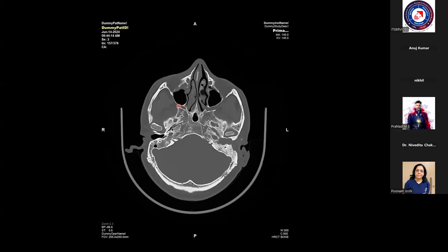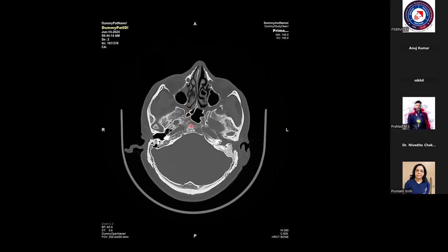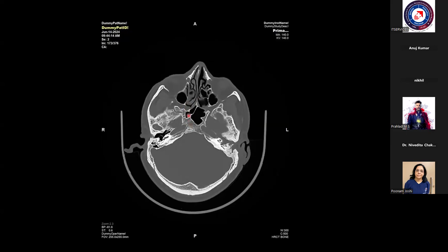This is the pterygopalatine fossa. Now I'm going above. I can see one posterior linear communication. This is the Vidian canal. Posteromedially, we have the palatovaginal canal, through which the pterygopalatine fossa communicates with the nasopharynx. Then again, if I go medially to the nasal cavity, it communicates via the sphenopalatine foramen. Now as I go above, just follow this pterygopalatine fossa. Here, it's not a true foramen, and therefore you can see over here, this is the foramen rotundum.